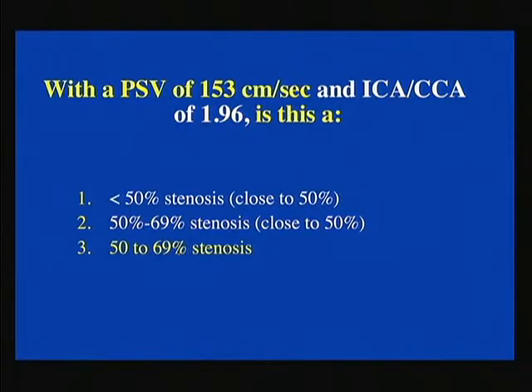oh, that shouldn't have worked that way. It should be here. No, there it is. Okay. Actually, peak systolic velocity. Let's go back. I misread the colors here. Sorry about that. I was so clever. Yellow up here is 1.96, correct? No one booed me. That's very good.